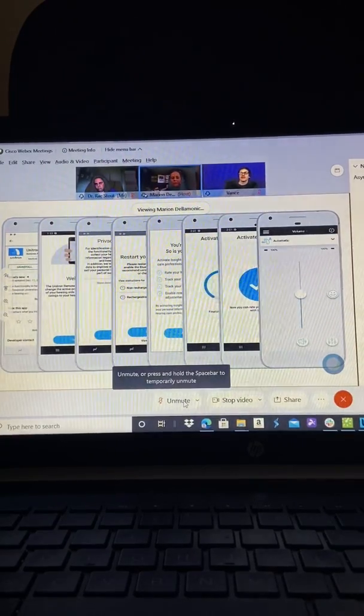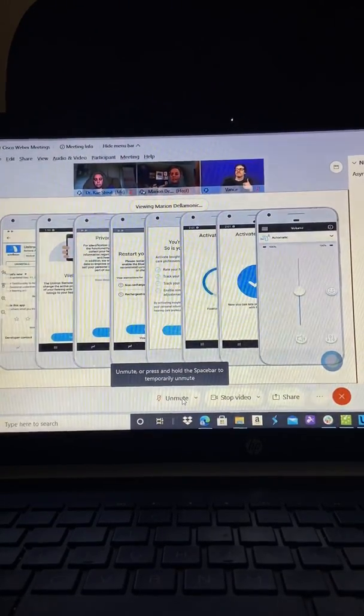All right, how are we feeling so far with Insights setup? 1 click in software, 1 click in the app.